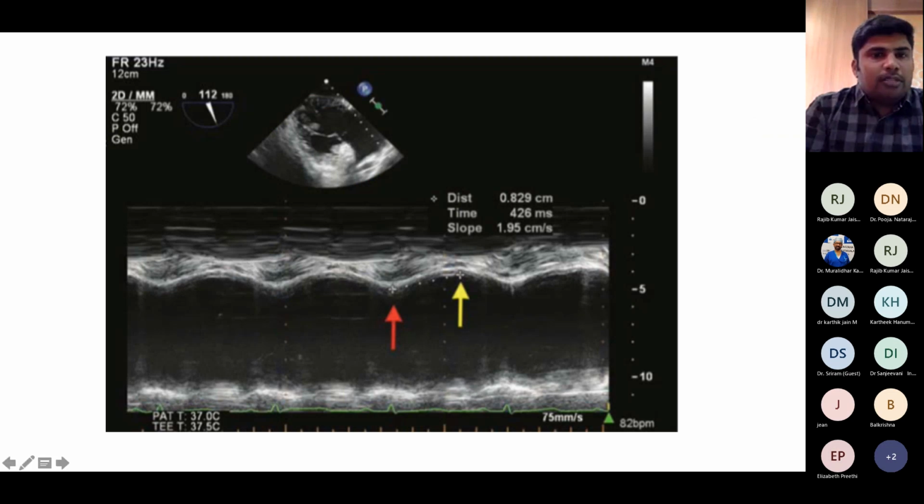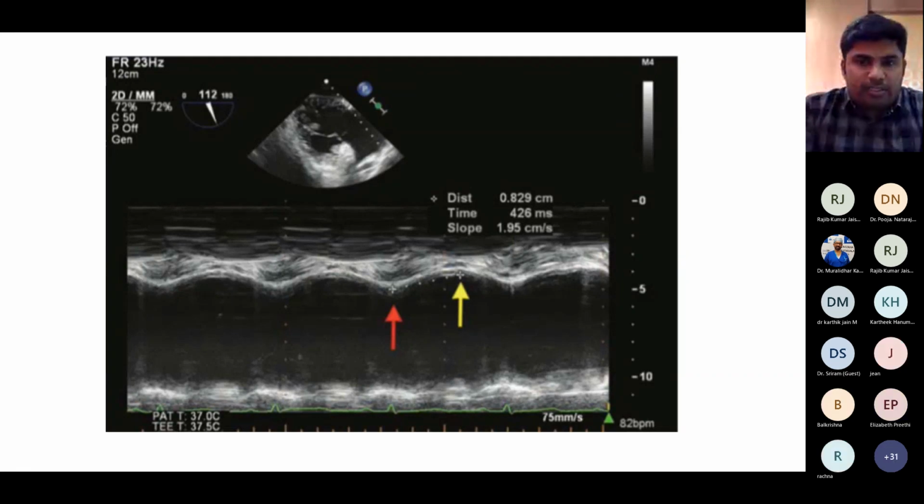Coming to the methods of quantifying systolic function of the right ventricle, one method is the tricuspid annular plane systolic excursion, which measures the degree of contraction of the longitudinal fibers of the free wall of the right ventricle. For measuring this, we can use the transgastric RV inflow view, which is obtained by first taking the transgastric short axis view, turning the probe towards the right, focusing on the right ventricle, and increasing the multiplane angle to 90 to 110 degrees.